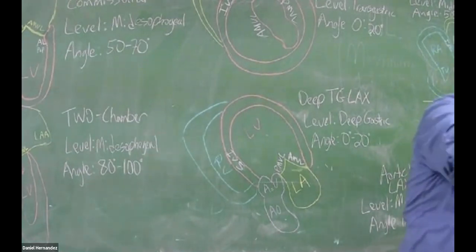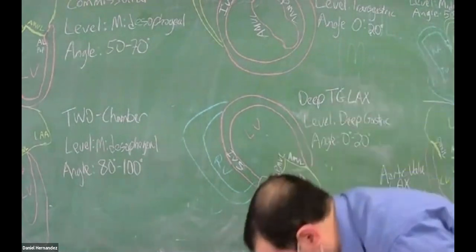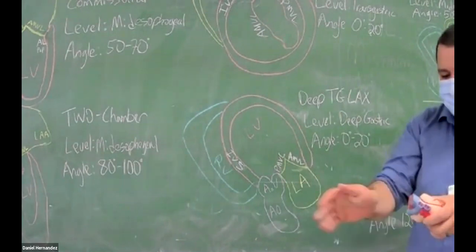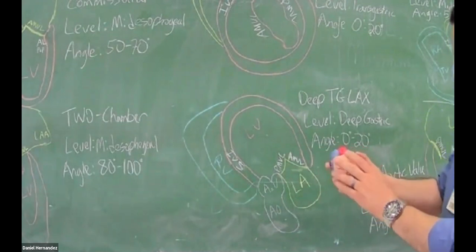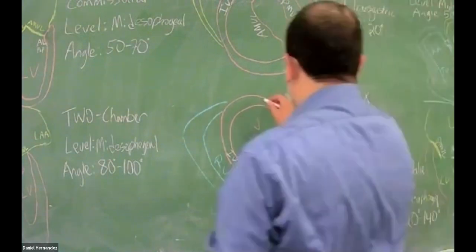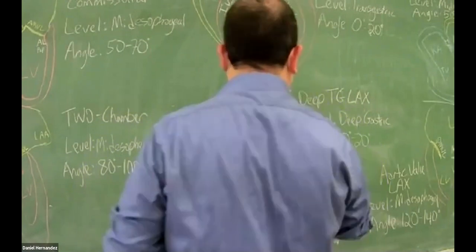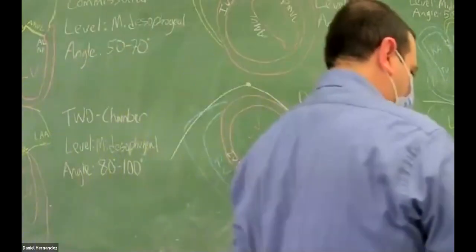Just getting an understanding of your probe position in relation to the heart, your transesophageal echocardiogram may help you decipher some of these images and what you're seeing. Like if that's the top of our transducer.